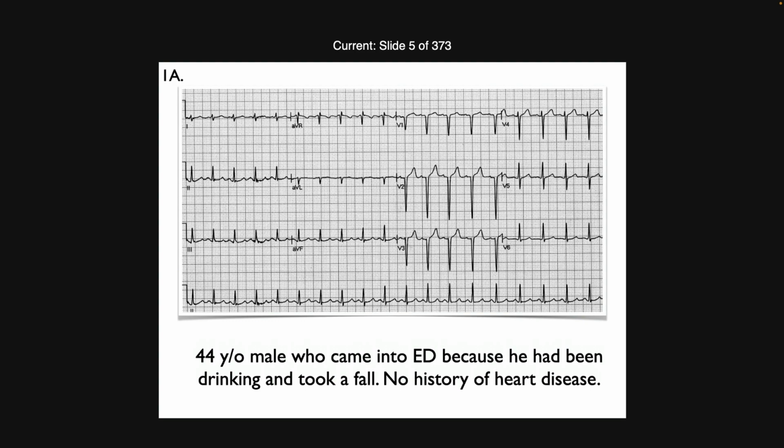Then look at the description of the patient and see if you can see, is there something that's a little weird in terms of matching up the 12 lead with the description of the patient? Is there something that doesn't quite fit? Nava, what do you think?